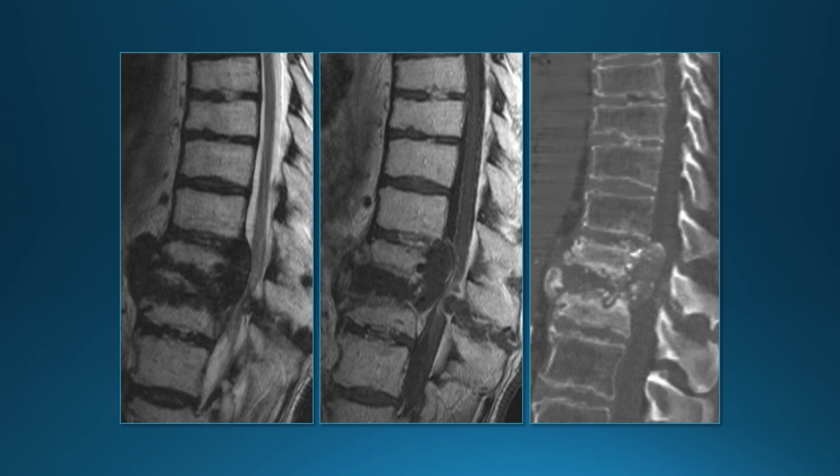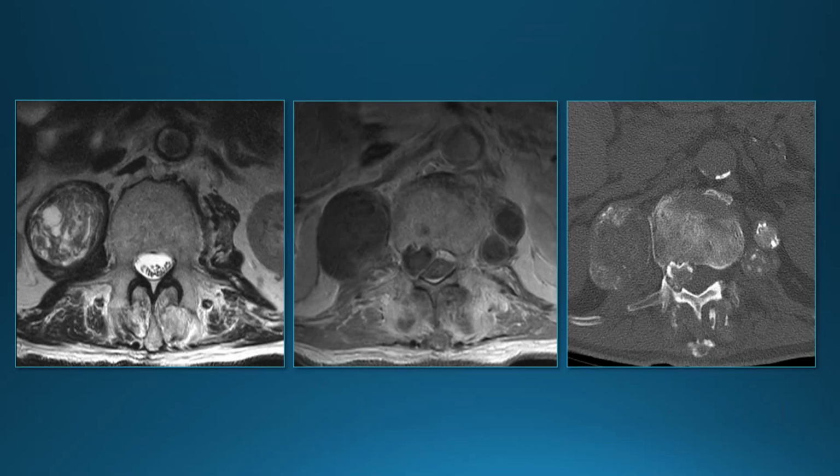Another patient, this is also atypical mycobacterial infection. In this case, on T2, the prevertebral and epidural component was dark signal, and you can see on CT it has calcification in it. And sometimes you can have calcification in these. This patient also has psoas involvement, and you can have calcification in the psoas muscles as well. So this is a patient, again, with atypical mycobacterial infection.